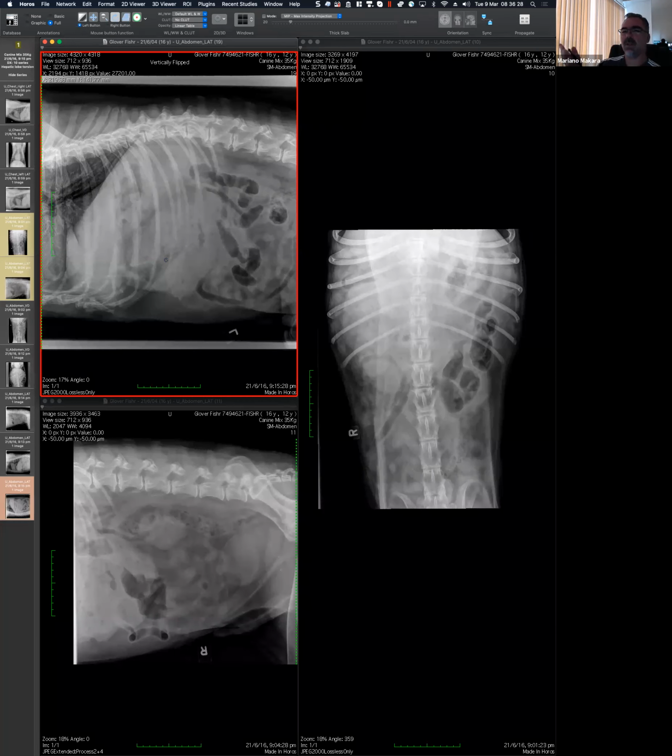In other words, I think we can end up with fluid within a torsion, gas within a torsion, without having to wait that long for the necrosis to show up. Right. The necrosis, I like the necrosis together with the possibility of a neoplasia, and then a superimposed infection, for example, an abscess, something like this. So that is perfectly fine in that list.